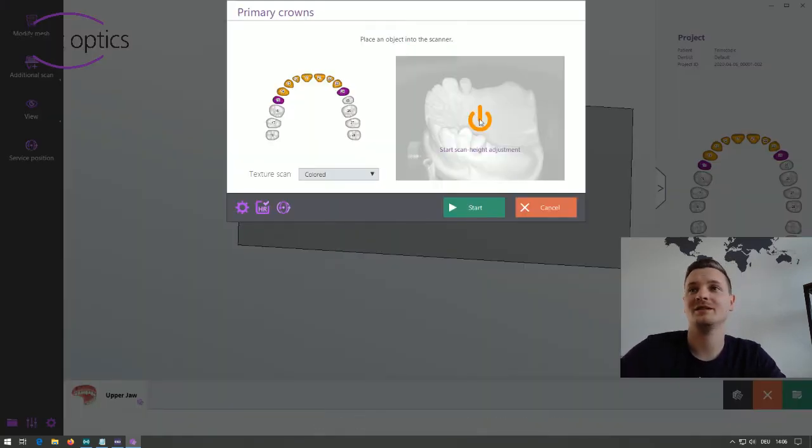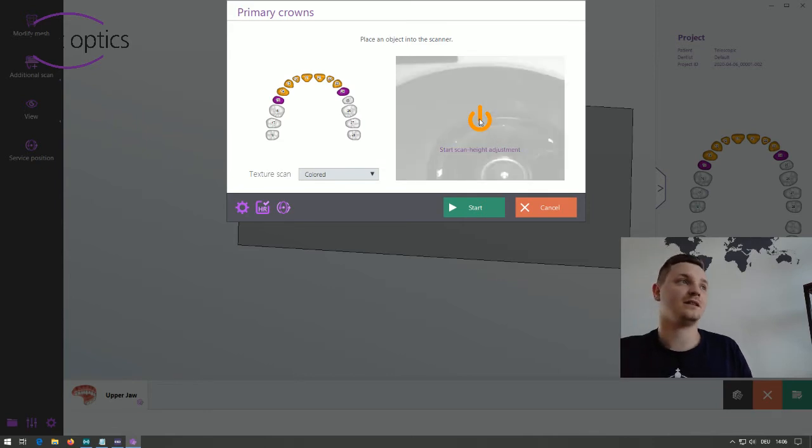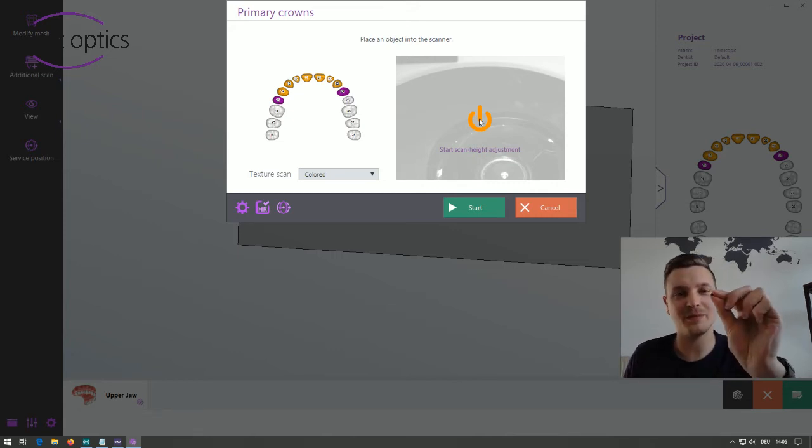And then I need to choose my multi-die holder. First of all, I will clean the telescopes up. Clean them a little bit, because it's not good to spray it twice. And then I have some small bubbles of Patafix here.